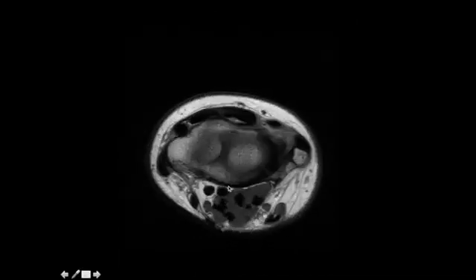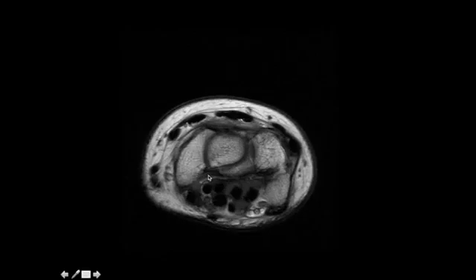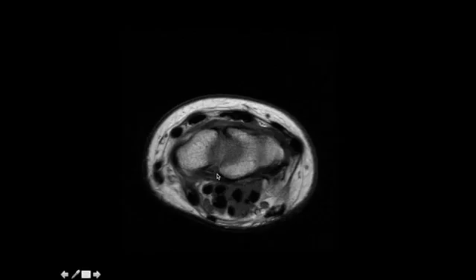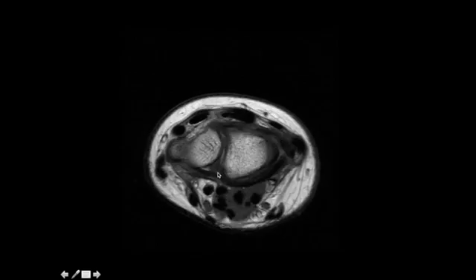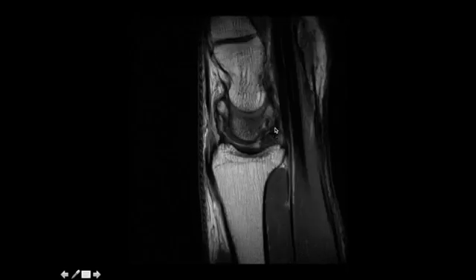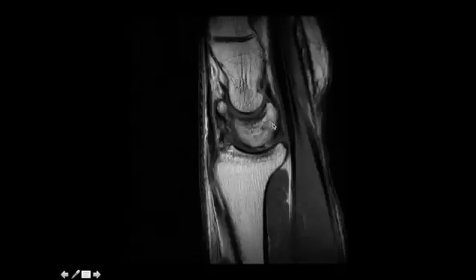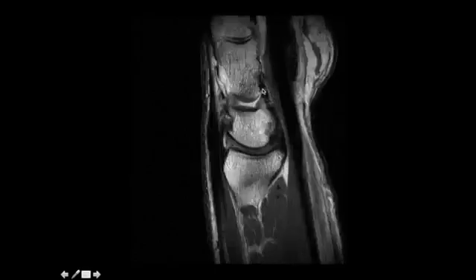On the axial and the sagittal images, these ligaments will blend in together to form this black structure. We'll see that the short radiolunate ligament is in close proximity with the volar fibers of the scapholunate ligament. And on the sagittal images, again, depending on what level we are, we can nicely see the individual ligaments which will form this black structure.